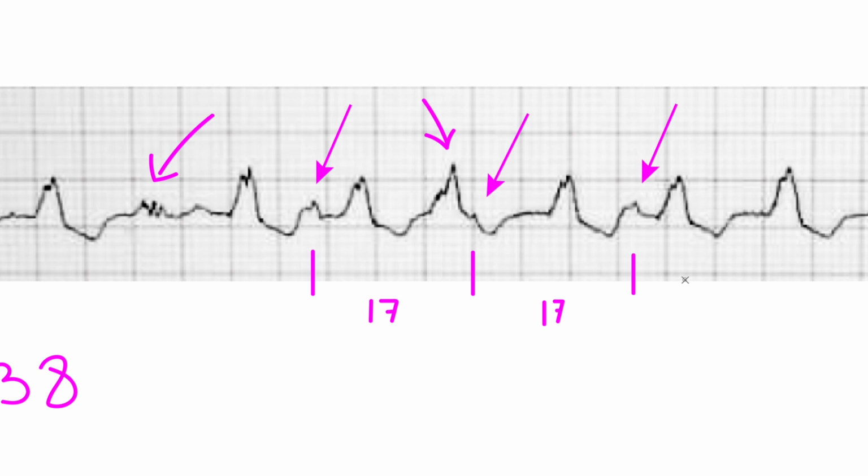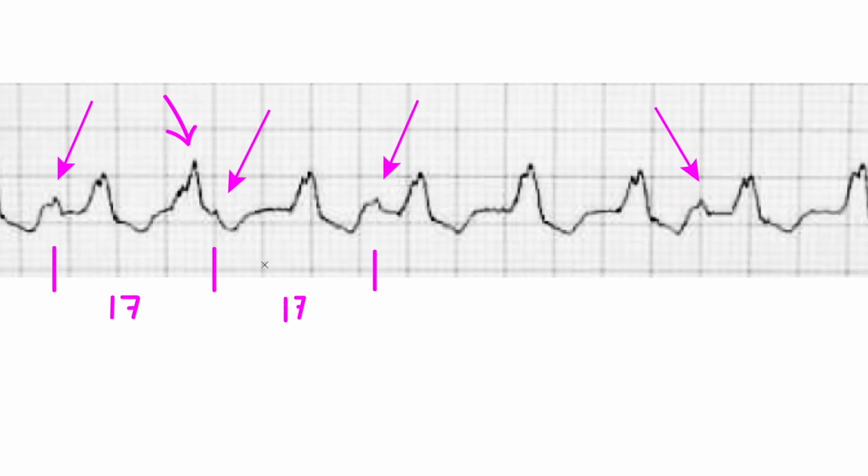And I bet if you take a little sheet of paper, like a Post-it note, make a couple of marks on it, and then paste this out, right? I bet if we started doing this, this would line up. So 5, 10, 15, 17. We should be looking at a signal happening right here. And just looking at this right now, see the top of this QRS? It lines up with this one. But here where we're supposed to be getting some atrial activity, the QRS is a little bit higher. See that? That could be atrial activity superimposed on the QRS.